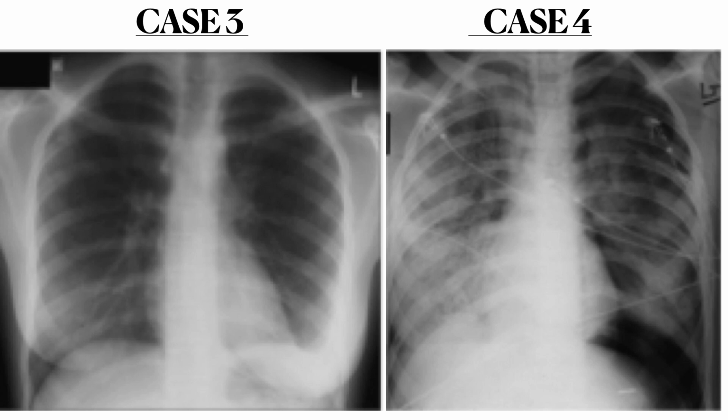Then we move to the fourth case, where we notice a decreased opacity in the left dome, which may represent the presence of air or gas in this area, and it is accompanied by a sharply defined left heart border. So all these features are related to pneumothorax.